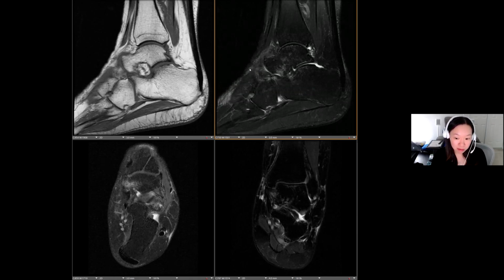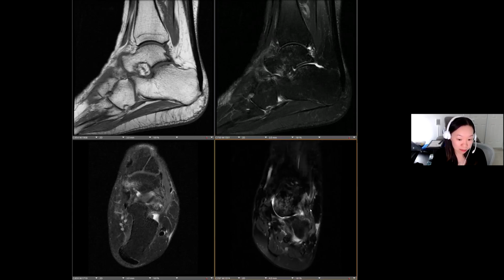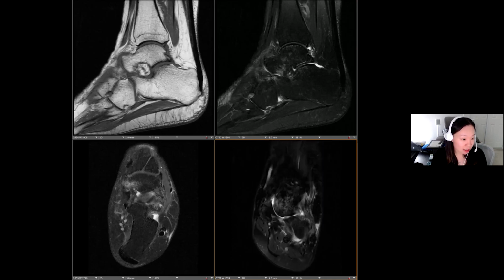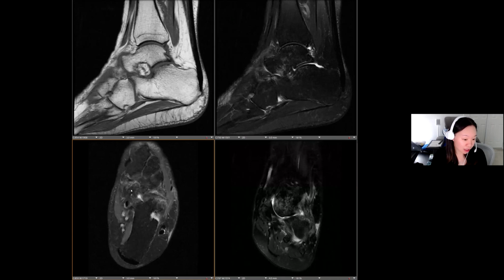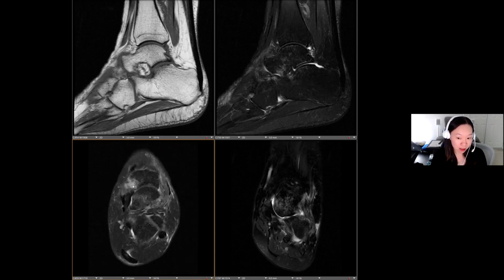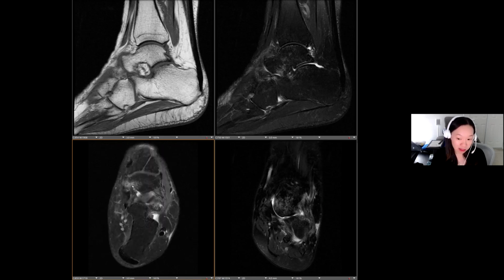But there are three major components, the most important being your superomedial component of the spring ligament. That looks like it's intact here. And then we have our medial plantar and inferoplantar longitudinal components of the spring ligamentous complex. That medial plantar oblique component looks like it's attaching in the region of that navicular fracture. Altogether, these findings are compatible with a midtarsal sprain injury.